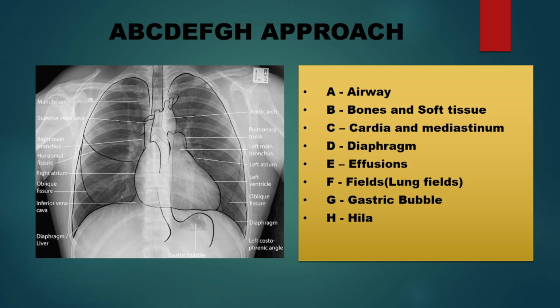So you should use whatever convenient method to assess the entire chest X-ray, and you should use the same method repeatedly. Then you will be easily able to interpret a chest X-ray, and then you can gather most of the information out of the chest X-ray.